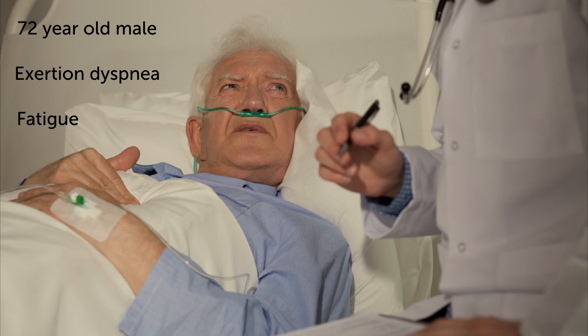Good. But this is not all that is in the guidelines. Before we talk more about the guidelines, I want to come to a case where we look at exactly what has been stated in the guidelines and try to apply it to this individual patient. This is a patient who was 72 years old, had exertional dyspnea and fatigue, and was brought to us for evaluation. We performed a pulmonary function test, and that was okay. So he had no pulmonary disease, at least no COPD, and then we performed the echo.